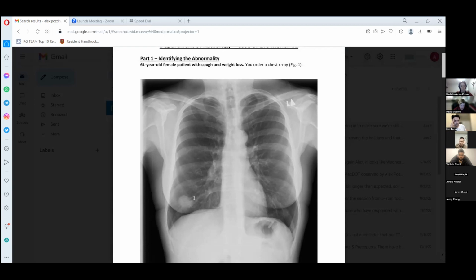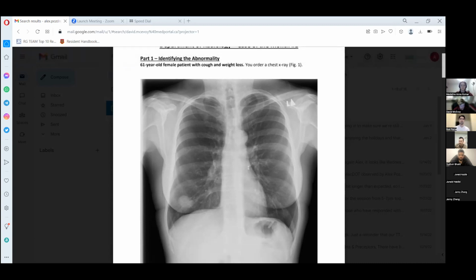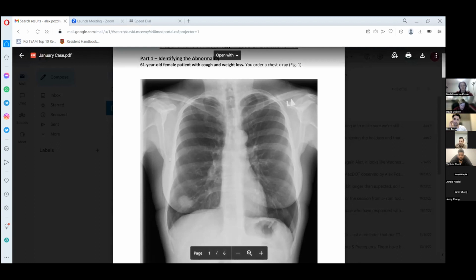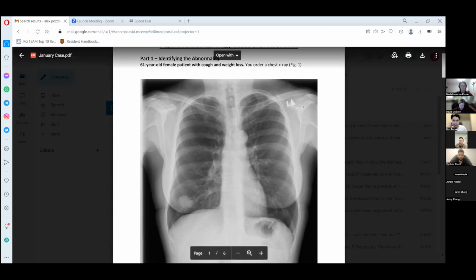And sometimes those anterior ribs might be so faint that they might create an illusion of a consolidation in the lung, but you need to make sure that it's something real, and it's not just a shadow created by an anterior rib. Also, we have a lot of other bones that the chest radiograph will capture. For example, we have the clavicles, we have the scapula here. We also have a little bit of the bilateral humeri. So we can also notice any abnormalities there as well.